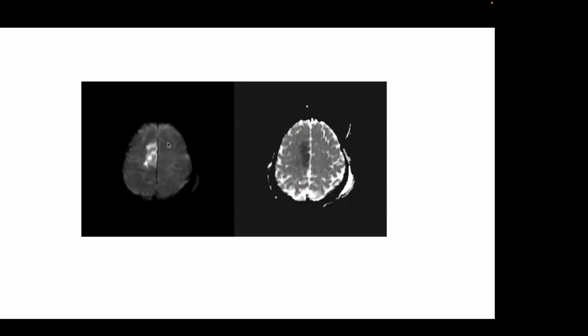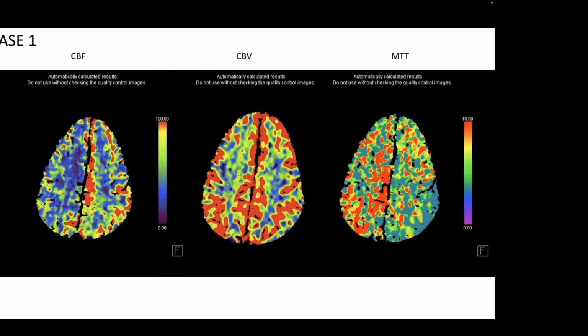Now, this patient actually, I'm sorry, can I have a question? Yes. So the right side is penumbra, that blue one we see? Exactly. That's a good way to think about it. This is the way a penumbra would look. Okay, thank you very much.